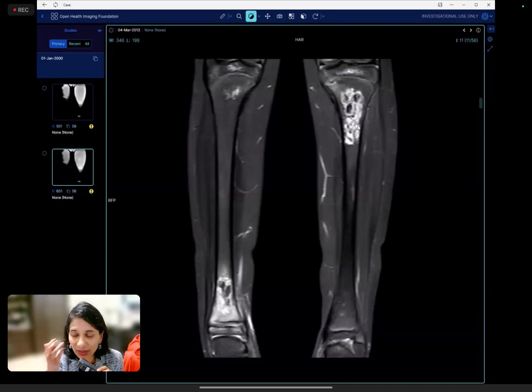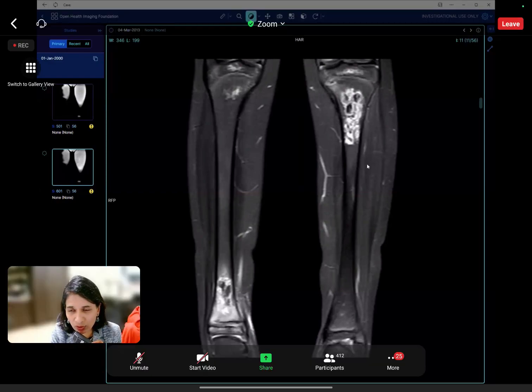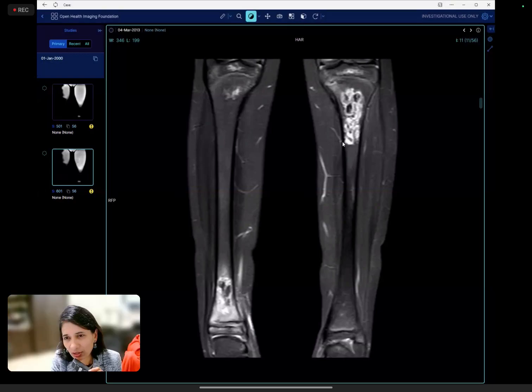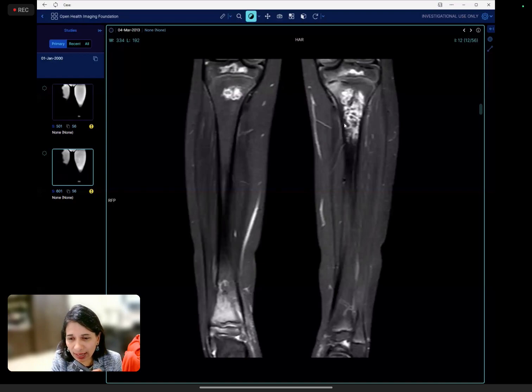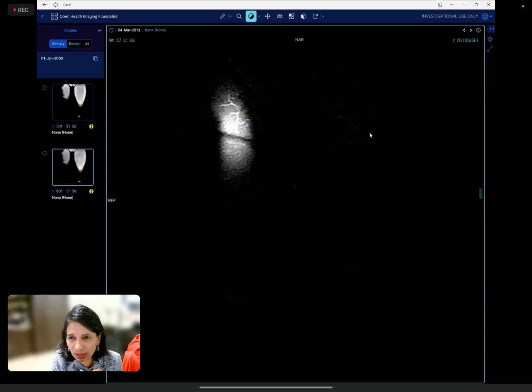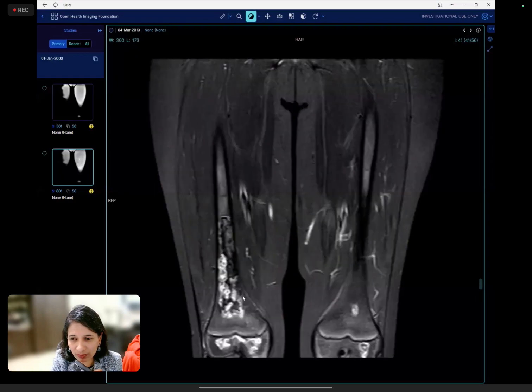It's sort of ischemic and then dying, and then it goes through the process of fatty replacement after it's done, and then it becomes sclerotic, which is what you see on the plain radiograph. These areas as sclerotic will be low signal intensity on both T1 and STIR images. Very well described, and also in the distal femur.